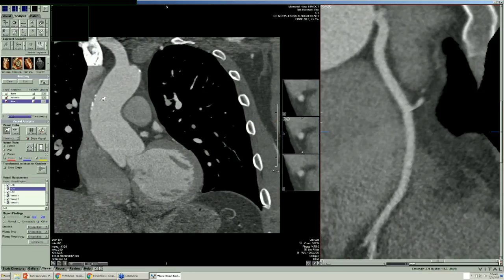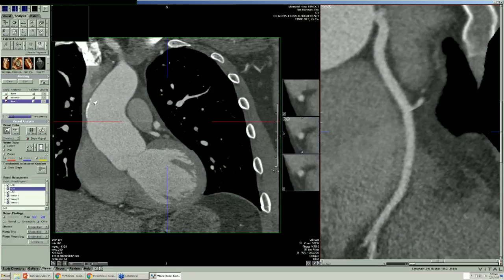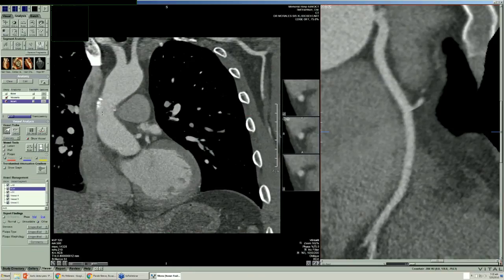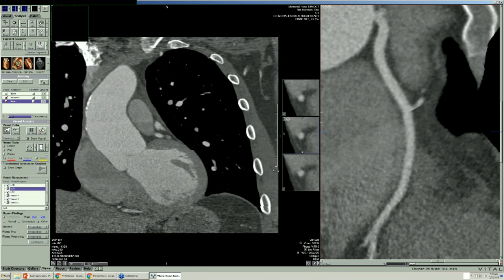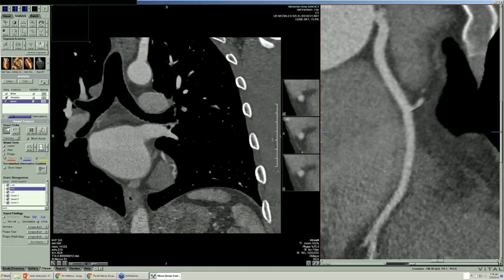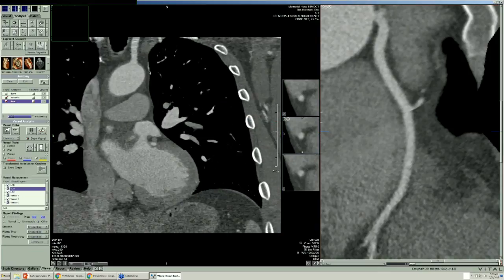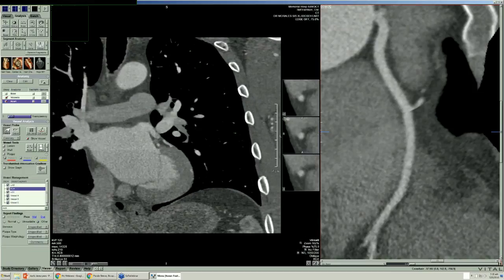Look, you can see some calcification of the ascending aorta. That's a sign that this is a reactive inflammatory type process because calcification is a result of that. So it's like an aortitis, in fact, if you get this kind of degenerative calcified changes. But that'll all be gone when you take it out. And so there is a piece of calcium up here showing that it reaches beyond the area we're looking at in terms of some aortitis up in here as well, which is just beyond the left, between the left carotid and left subclavian.